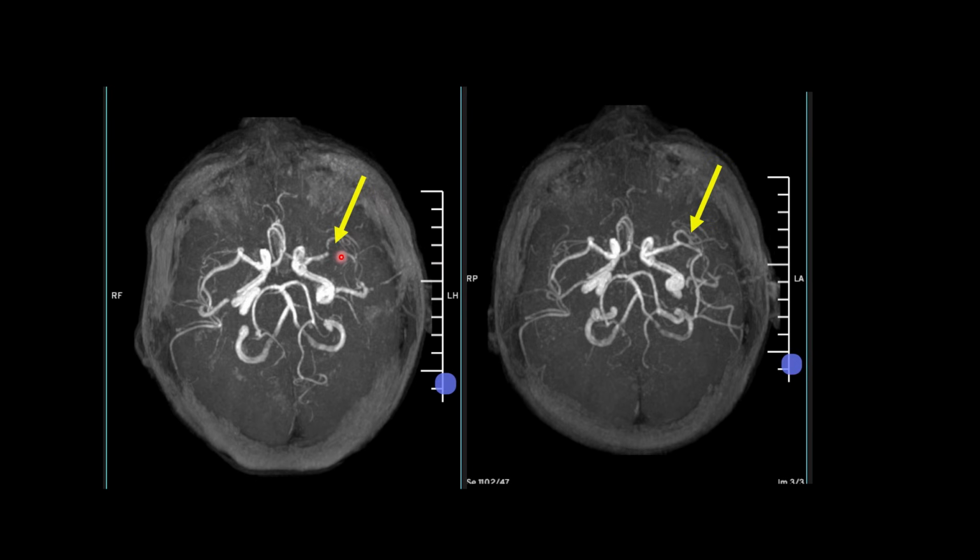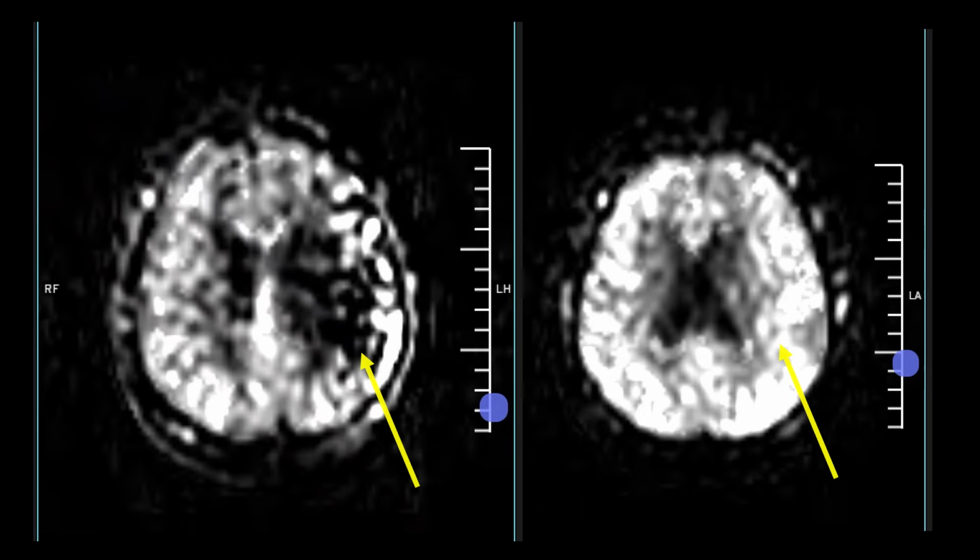There's a partial occlusion, the attenuated. Now you can see the distal collaterals are better. M2, M3 collaterals are better when compared to the previous image. And this is an MR perfusion technique, arterial spin labeling. What I showed earlier was a colorful technique. This is the source images. This is what we are more comfortable with, where we can see how black it is and it has become totally white post perfusion.